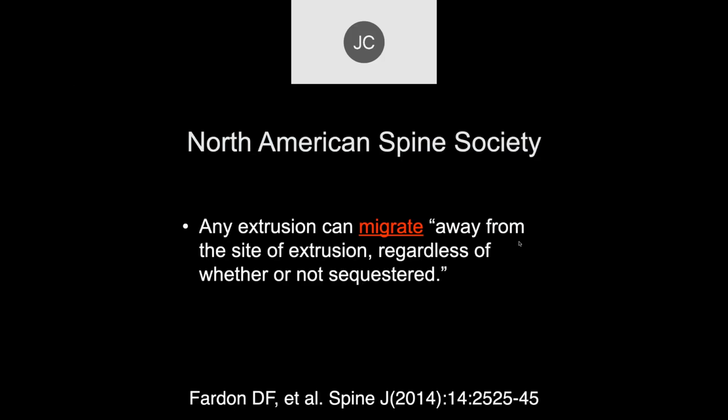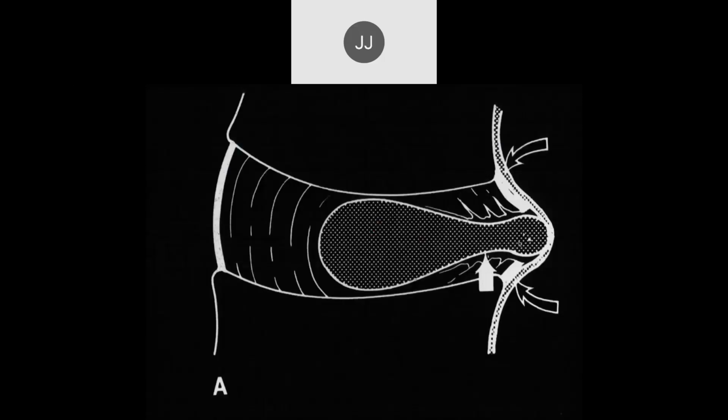So you kind of look for that. I think what I see on that photo is some leaks through the annulus, and the leaks, if you inject them, they absorb that stuff pretty fast, and that's why I think you get the relief.